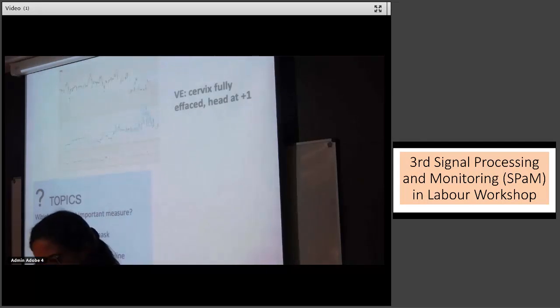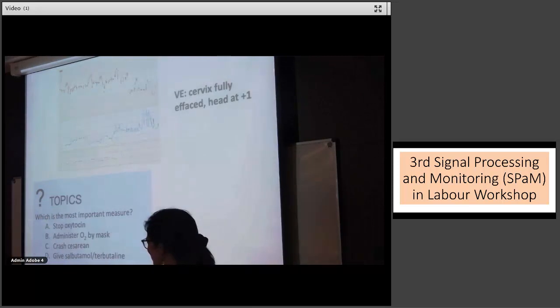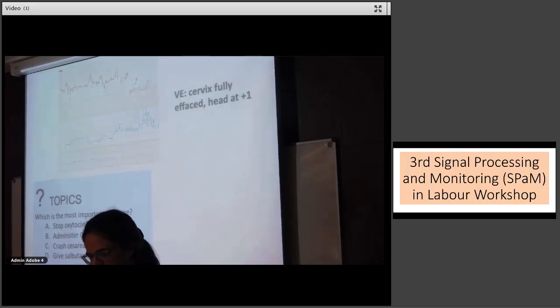Barry and Diogo have already made the point that oxygen is useful to the obstetrician, so you can take that one out as well. I agree with Diogo that with the oxytocin, the further labor advances, the less oxytocin you need. So if it hasn't been stopped at that point, I would. I personally would wait to see the impact of stopping the oxytocin on the CTG pattern before deciding whether to give terbutaline or not.